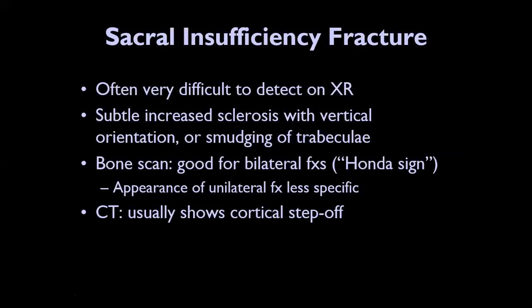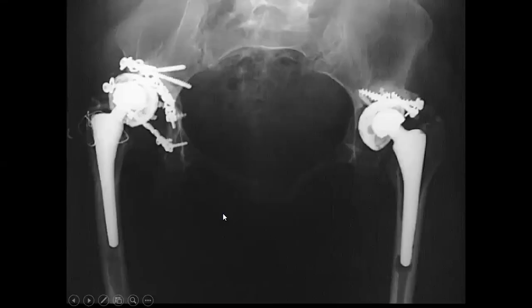As he mentioned, it's very difficult sometimes to detect in X-ray, as what happened with us. Maybe you can find some sclerosis, and this is the golden eye. Here, the role of the golden eye: when you have your golden eye, then you can reach it easily. But okay, bone scan, this is the most important, to know what is called the Honda sign, which I showed you. And sometimes it could be unilateral. Okay, sure that the CT will be the best.